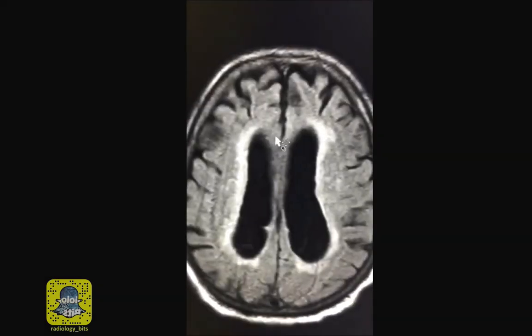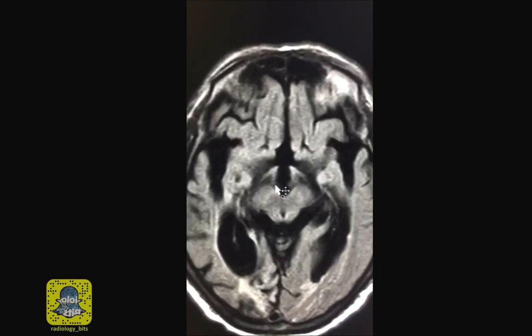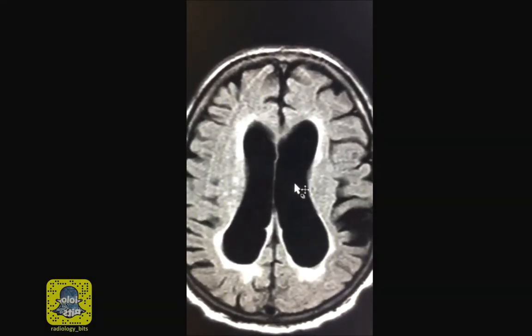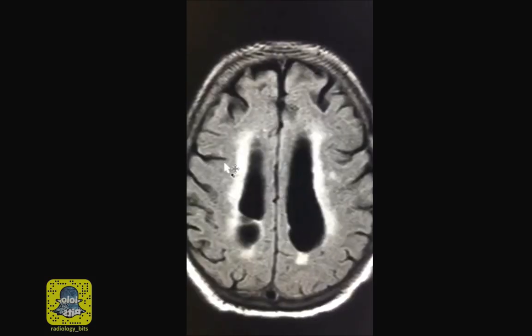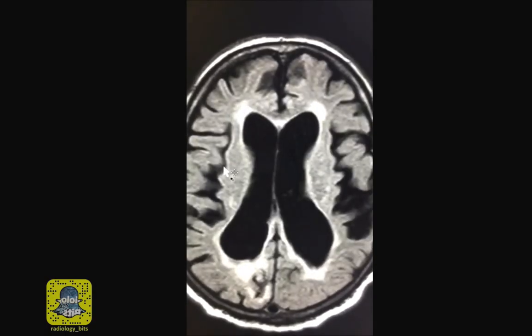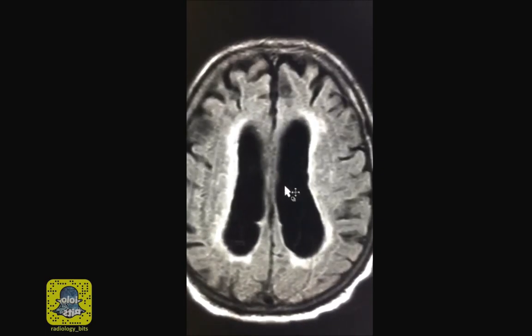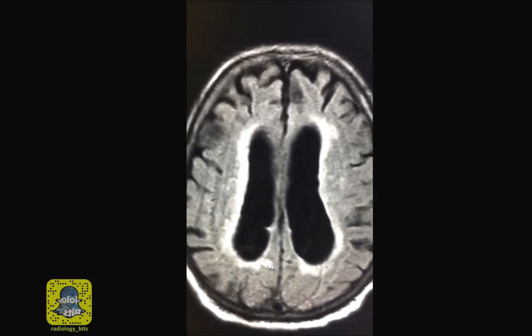The issue arises here from the pronounced appearance of the ventricular system. This is a larger ventricular system than what you expect. The question is always, is this dilatation of the ventricular system, or is it related to a more pronounced appearance due to volume loss? A very simple and subjective way to answer that, ask yourself, is the ventricular size proportionate to the volume loss? Meaning that the ventricular size should be corresponding to the degree of atrophy or volume loss that you see with aging.